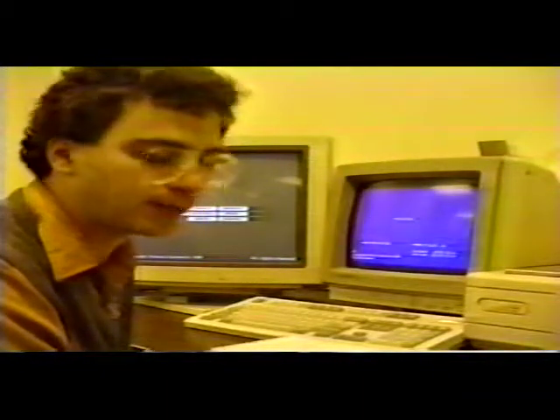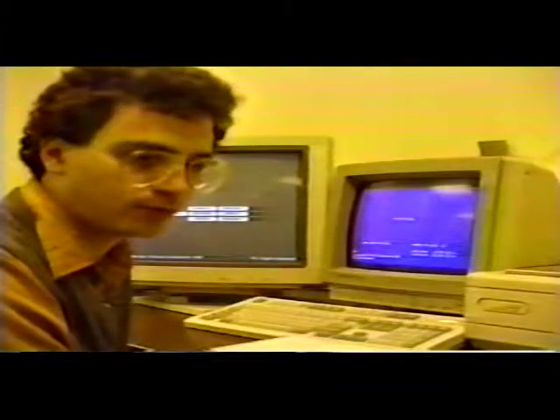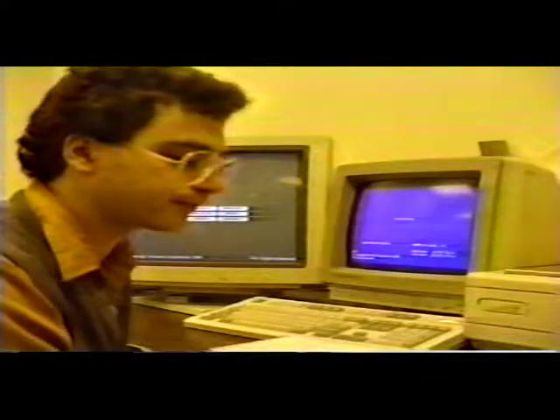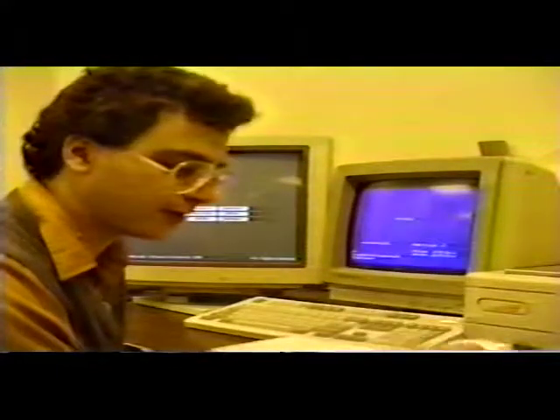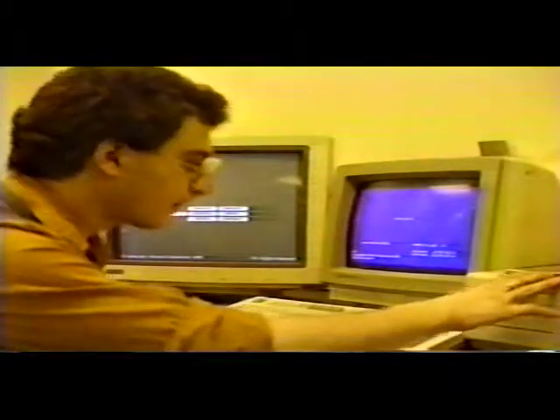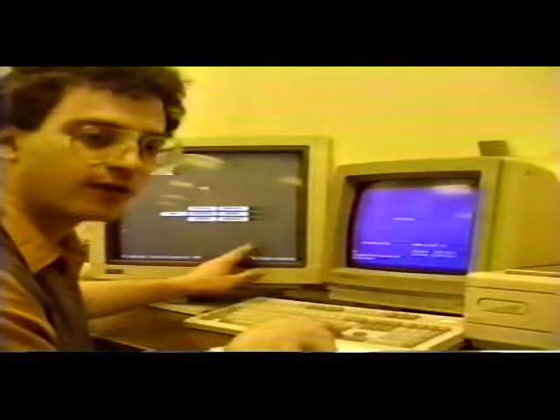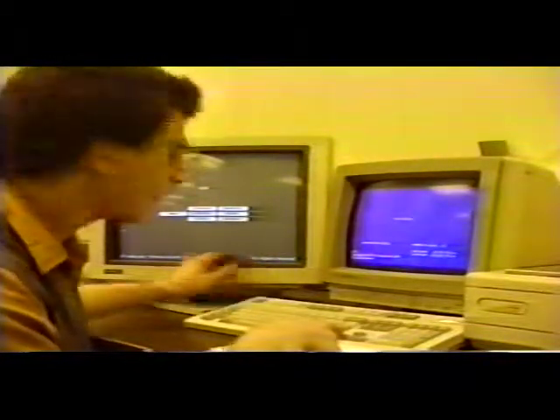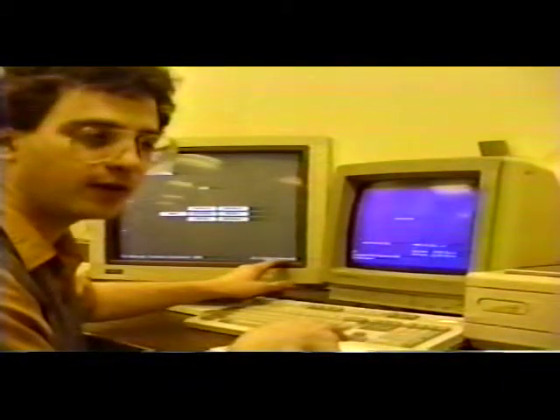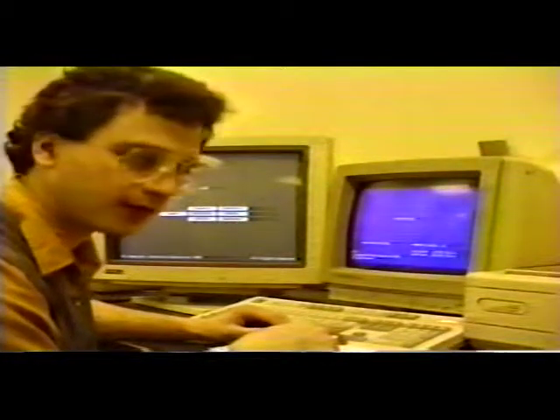The discs are a by-patient archive, which means that you have one disc per patient, although the system is easily modifiable to have multiple patients on the one disc. Most of the system is driven by this mouse, and it runs on a standard IBM PC AT with a main screen, which we have in color, and a screen for the medical images. This is a 1280 pixel by 1024 pixel display, 8 bits per pixel. It's manufactured by a company named Number 9 Systems, which is in Cambridge.